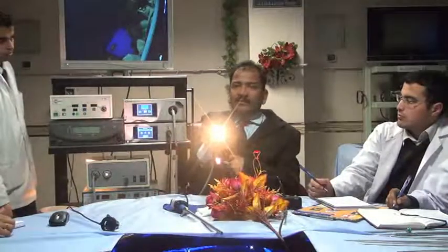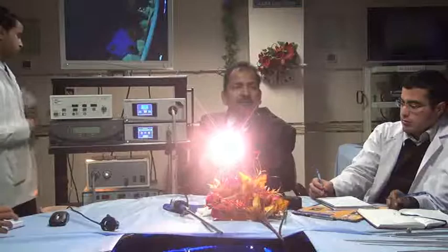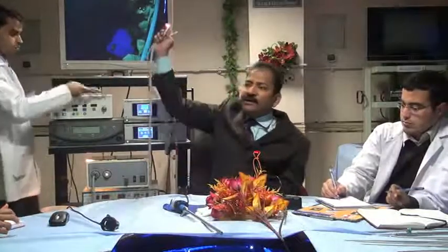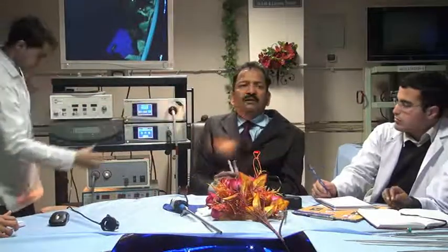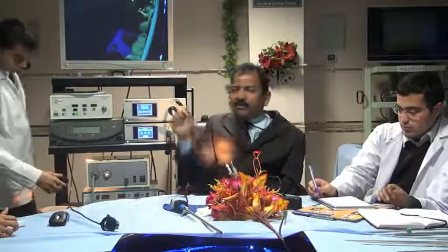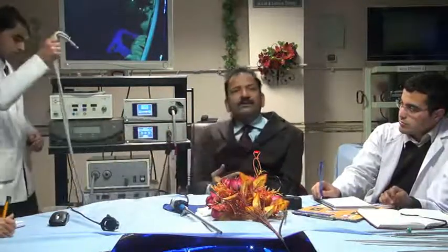So this is inferior color temperature. This is approximately 3,500 and this is approximately 12,000. So you should buy good color temperature. Even if your color temperature is not good, the white balancing can adjust. But if you have a good color temperature, the quality of image will be better. LED is good.